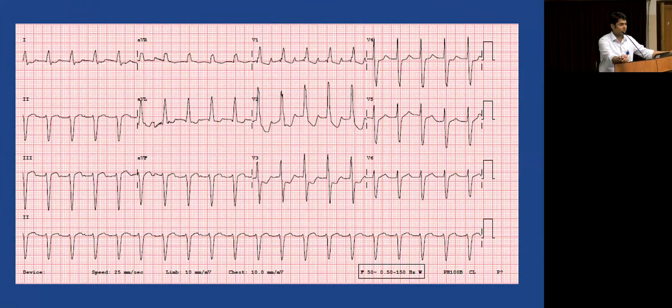Now, the second question is, what's the relationship of QRS to P? So you're saying 2:1 because? That's good, but where do you think it is? This is a P wave, that is a P wave. Why are you able to see any P wave? I'm not really sure if it is seen. You're expecting it, or probably it's buried, but you're not able to see the P wave right there. So still you may pass it off as 1:1.